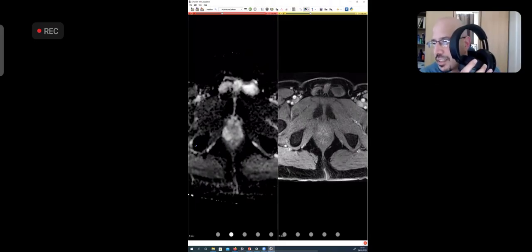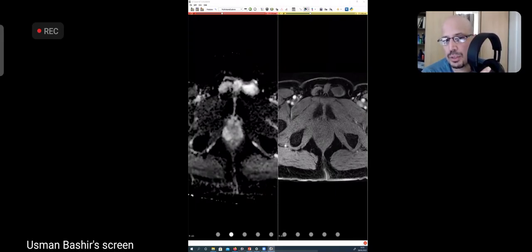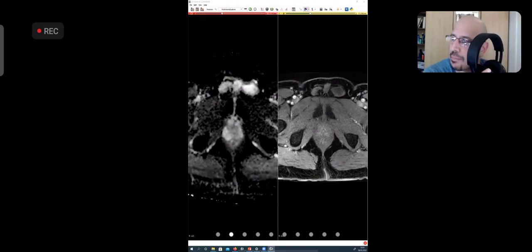Finish this case. So let's look at this second lesion. I really want to drive home this message, and let me tell you guys, this is not an easy case. You understood as I explained everything. I would think it was a success for me in being able to convey something, because this is a difficult case. So if you look carefully at the corresponding site on the left gland apex, you can see that there is enhancement happening. Now you're kind of reaching. Okay.